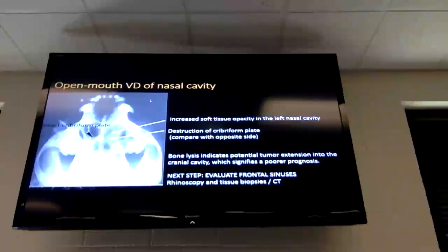It's more like soft. Yeah. Or fluid. Right? Always remember those together. So soft tissue, for example, if it's a mass. Fluid, if it's mucus in the nose, right? So can you tell the difference based upon the opacity, if it is mucus or if it is a mass? You cannot, because they look the same.